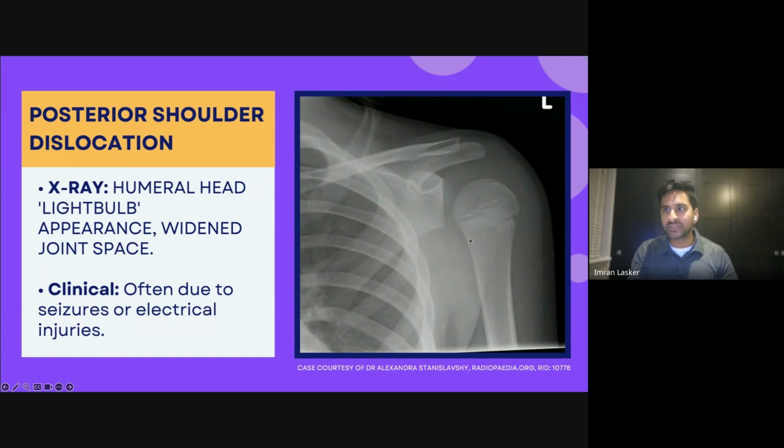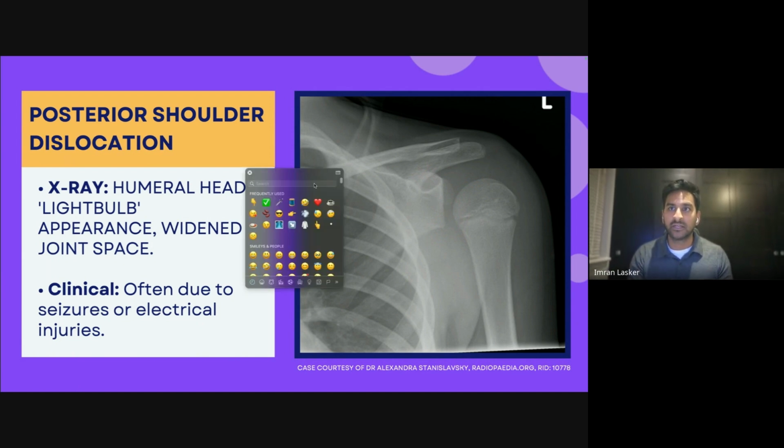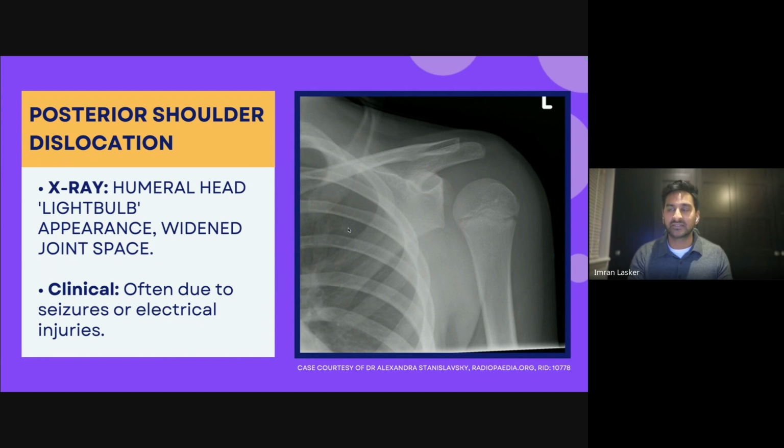dislocation. Now, on this particular image is not the easiest one to see, because your glenoid is here, and then your humeral head does look like you could fool yourself into thinking that actually it's all right. And that's when it's very useful to have that Y view or the armpit view, the axial view, to try and see whether things are really aligned with one another. And do you remember when I was saying, how do you know which was posterior and anterior? That coracoid process is going to tell you what's anterior. So if it's gone posterior to that, then you know it's a posterior dislocation. If it's gone anterior to that, or the same direction to that, then you think it's anterior dislocation.